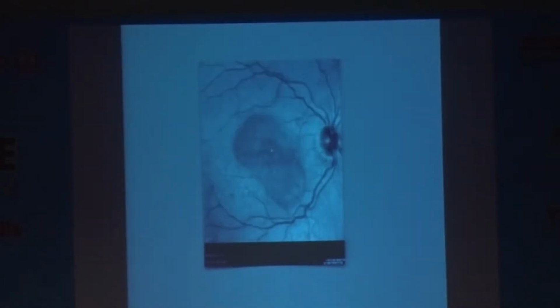Retinal pigment epithelial detachment is almost always hyporeflective with a hyperreflective surrounding area. Interestingly, one study said that if you see a hyperreflective center in a pigment epithelial detachment, that detachment is more prone to developing an RPE rip.